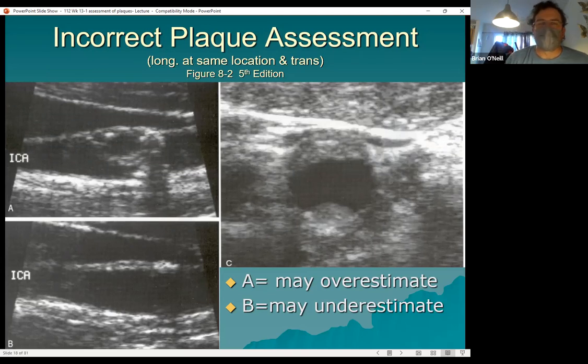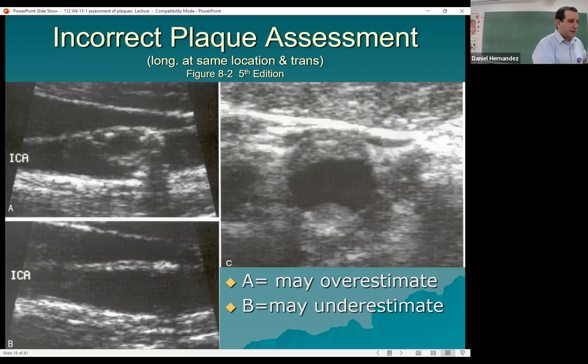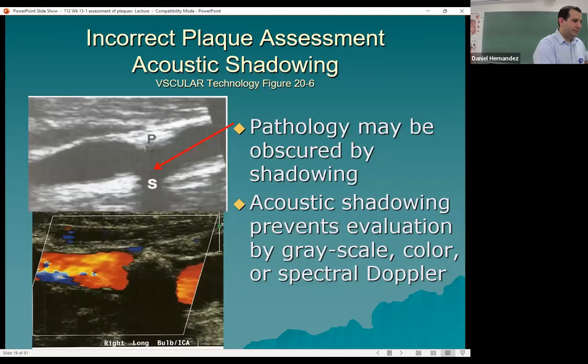You can still use those area measurements. I'm surprised you went that far. I mean, sometimes they'll allow you to just kind of eyeball it. You can look at it like, all right, that's greater than 50, or that's probably greater than 75. It's because the velocities didn't indicate more than the 70% stenosis, but the area did, so she wanted to be precise.